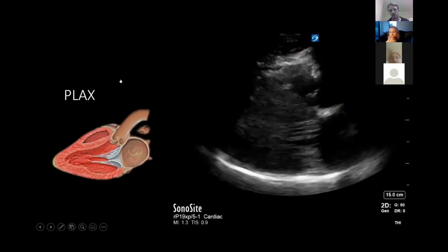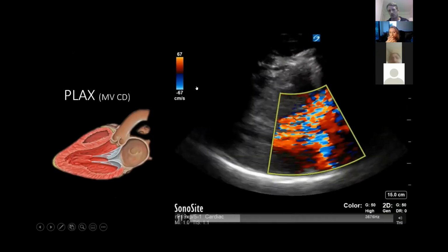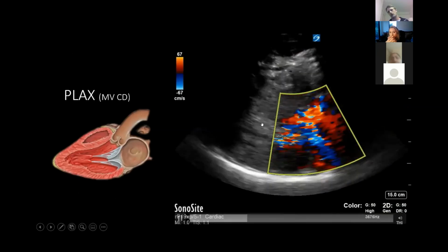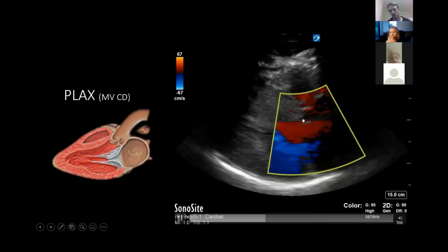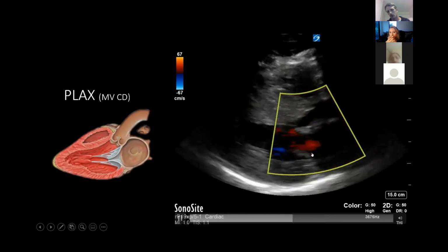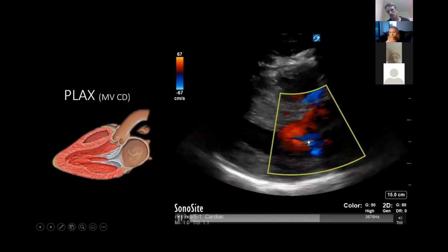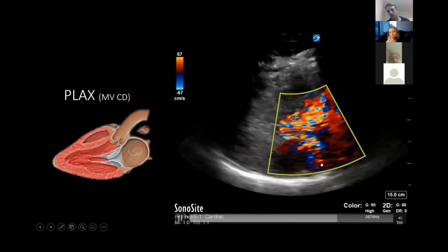So this is significant left ventricular hypertrophy. And you can see here, with the eye of faith, there's a lot of noise because things are moving at high velocity. But at the bottom right of the screen, there is a tiny bit of posteriorly directed mitral regurgitation. So there's a little bit of mitral regurgitation there during systole.